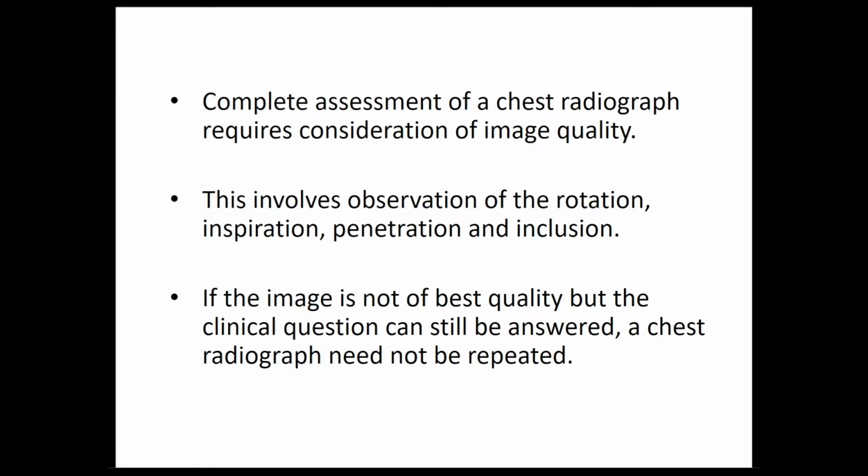Complete assessment of chest radiograph requires consideration of image quality. This involves observation of the rotation, inspiration, penetration, and inclusion. If the image is not of best quality but the clinical questions can still be answered, a chest radiograph need not be repeated.